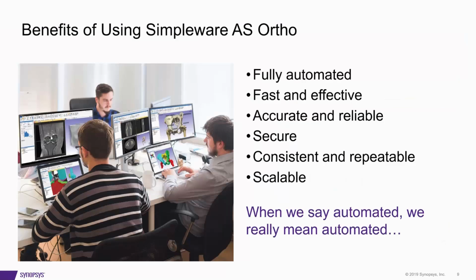The benefits of using the Simpleware AS Ortho tool are really that it's a fully automated solution. You'll see in a second it's a one-click solution that really eliminates hours of manual processing. It's fast and it's effective. You can get results in between 1 and 3 minutes on a standard engineering specification laptop.